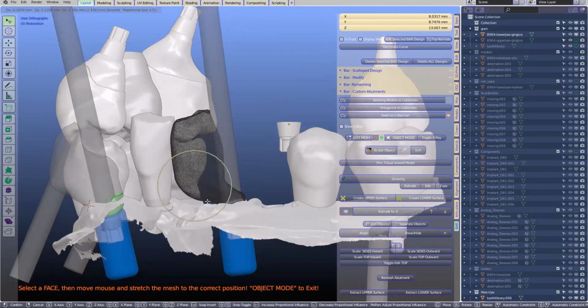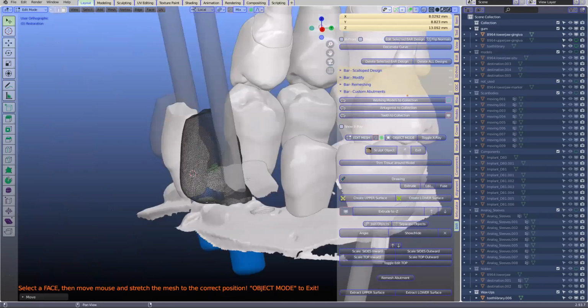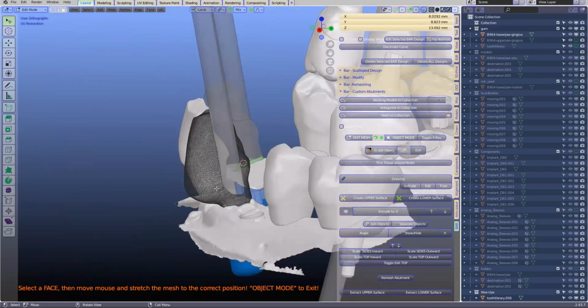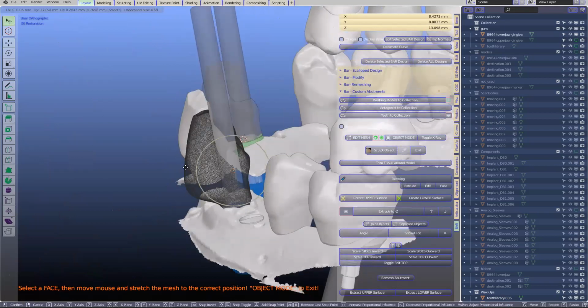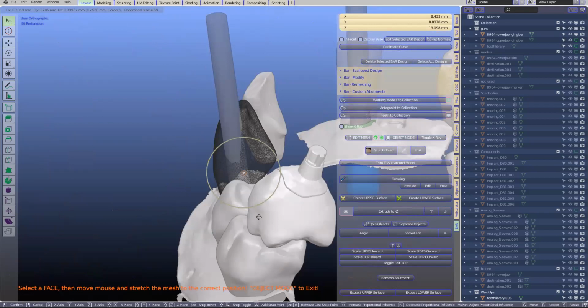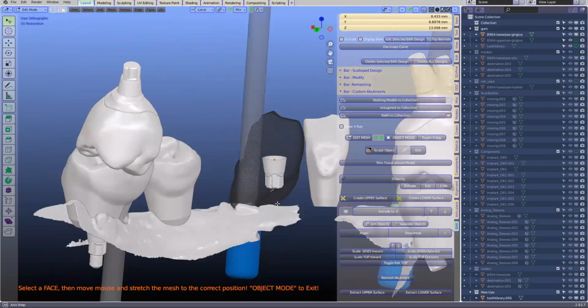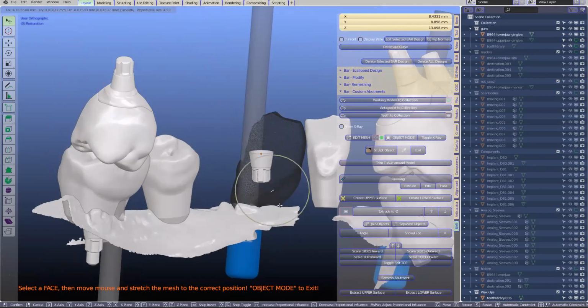And of course, this is a really, really challenging case, isn't it? Magnet tool on. Yeah, it is. We're going to stick this to our screw like that. Here, what we can do is move that down a bit, something like this.